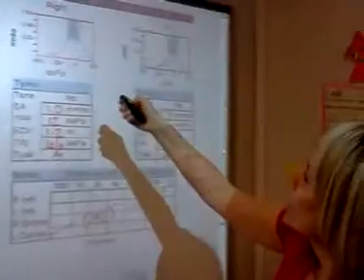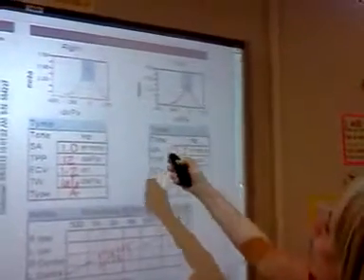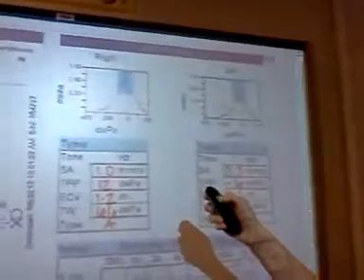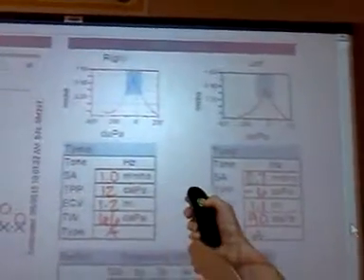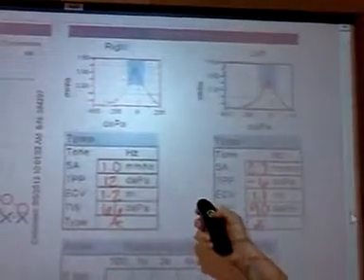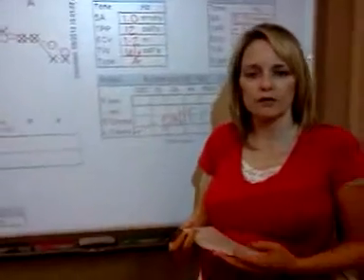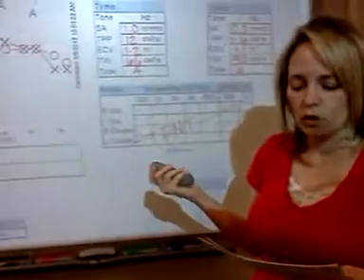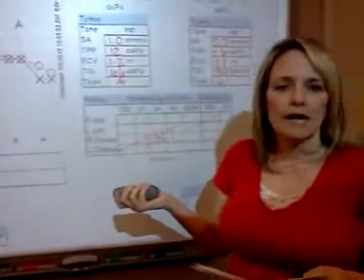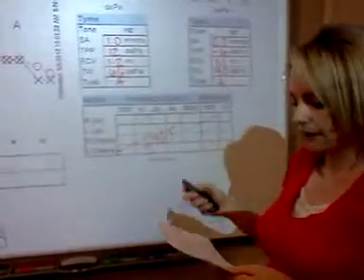Okay. On the top right side of the audiogram is what looks like a picture of a mountain, and this is called a tympanogram. And a tympanogram measures the air pressure in the middle ear. The results from the tympanogram help the audiologist to decide if there is a punctured eardrum, or if there is fluid or wax in the ear, and if the middle ear system is working correctly.